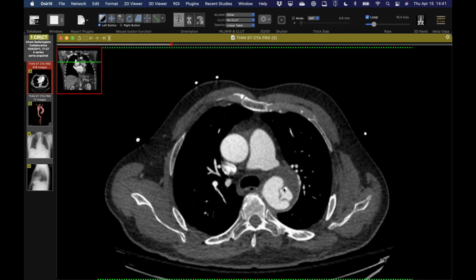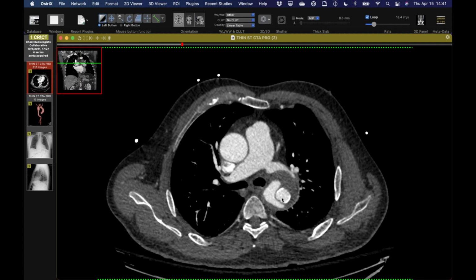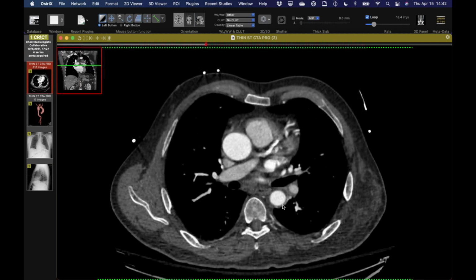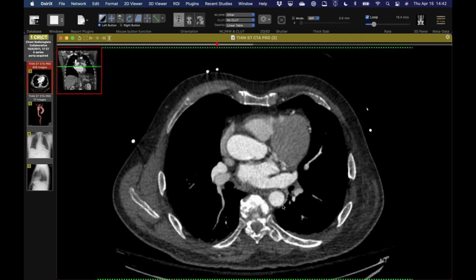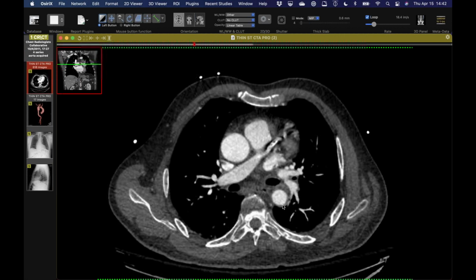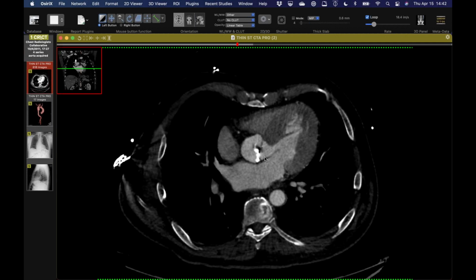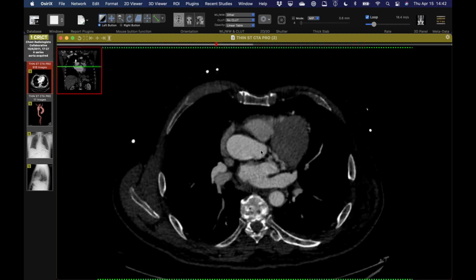This is a patient who has some effusion or thickening there. But what caught my attention was this funny appearance in the mediastinum here. We see displacement of the airway, and the aortic arch or aorta itself looks a little unusual. You can see there's some intimal calcification here, and there's some soft tissue lateral to it. So I wondered if he had an aortic aneurysm or something like that. And luckily I had a CT scan that we had done here. And so this is his scan that predates the radiograph.